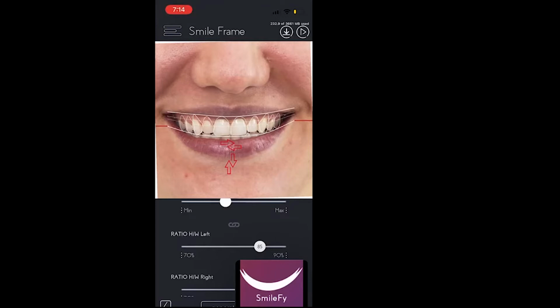As I said in the beginning, the patient came in just to fix those two laterals as she thinks they are too short. But by looking at the patient's premolars and canines and even the laterals, I noticed that the patient has a lot of gingival exposure. So I told her that we could improve her smile not only by doing those laterals, but by improving the entire smile by doing a small plastic surgery on her gums and increasing the length of her existing teeth.